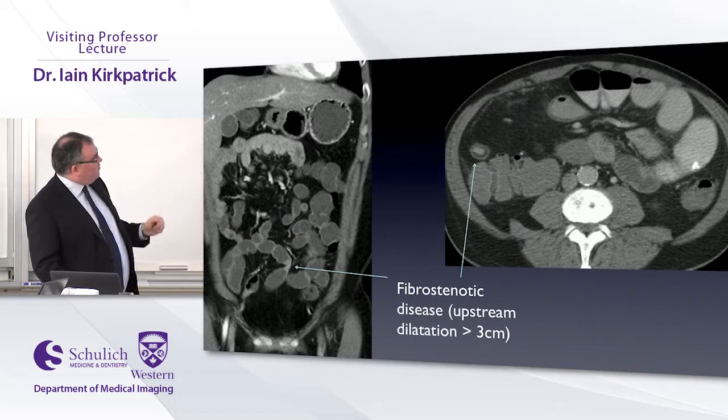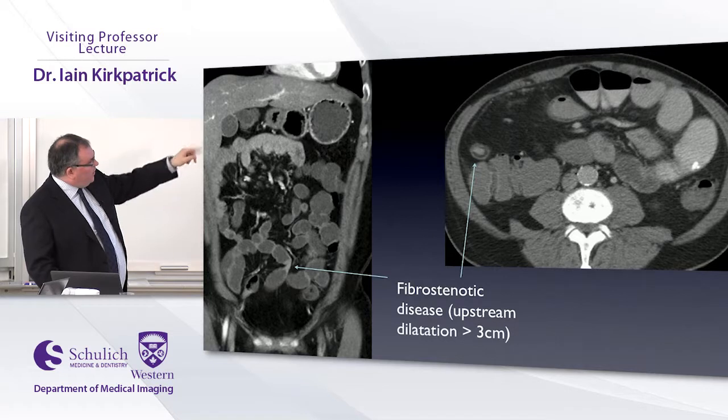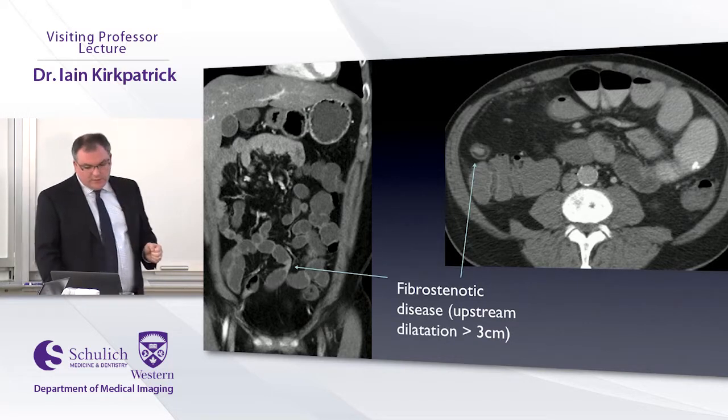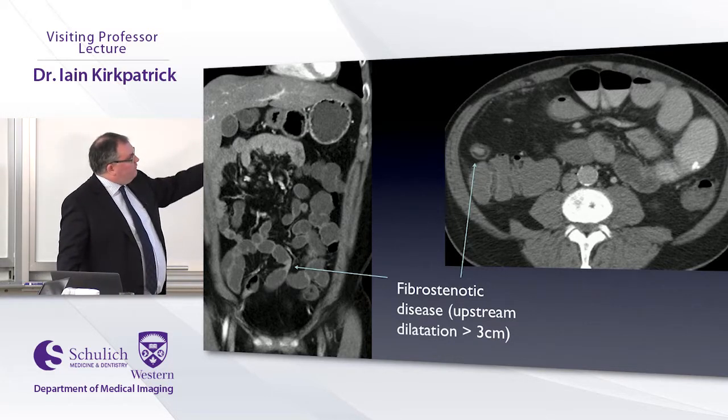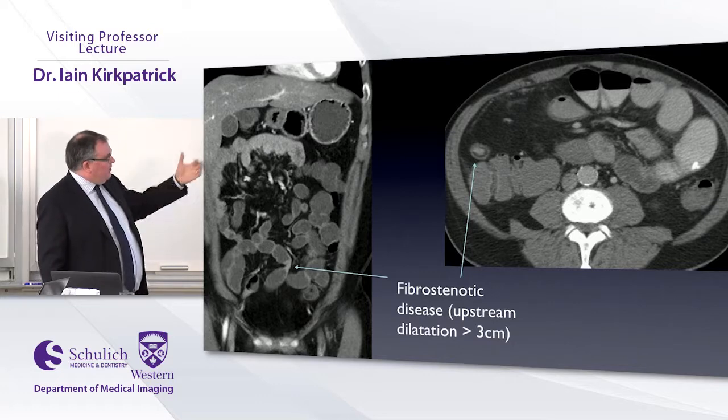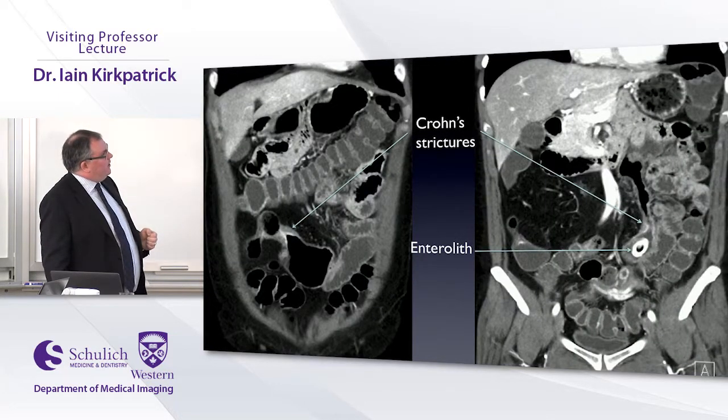And then this is sort of more of a classic fibrostenotic area. It just never opens up, and that was actually present on a couple of different scans, so we were able to catch that one. It can be kind of tricky though. When the wall isn't thickened, you have to sort of differentiate, is that just spasm? Because remember, you've given people polyethylene glycol, so you might get a little transient dilatation. If you have multiple scans, it's a lot easier to tell.